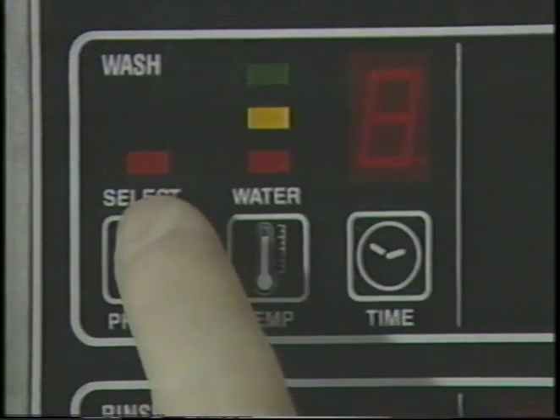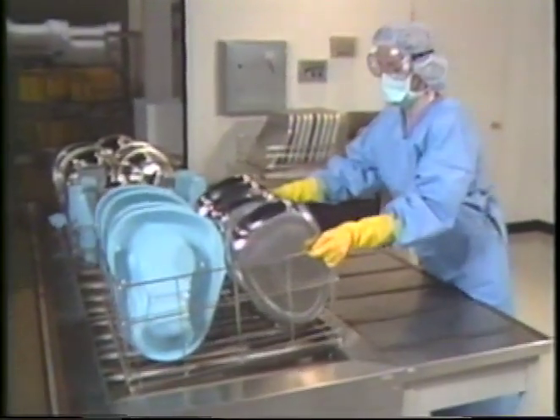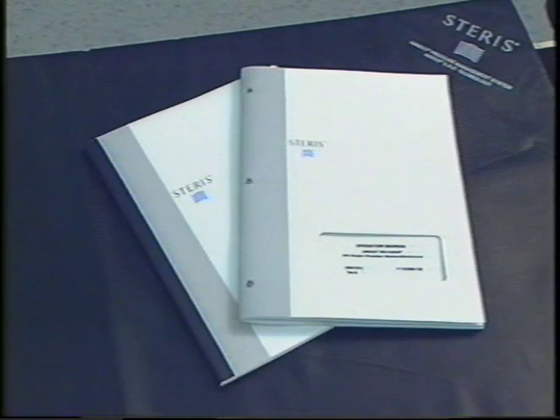For example, many in the animal care community recognize 180 degrees Fahrenheit for 3 minutes as the industry standard to achieve sanitization. Cycle times also vary in relation to temperature and amount of soil. Shortest cycle times usually range from 1 to 4 minutes to longer cycles reaching 5 to 9 minutes. In all cases, the appropriate cycle and temperature setting should be determined by checking with the manufacturer of the device or labware being cleaned and the washing equipment being used in order to promote the greatest efficacy and safety.